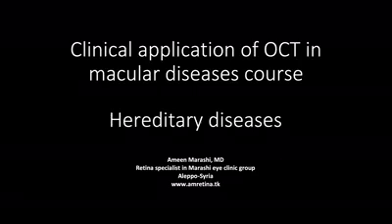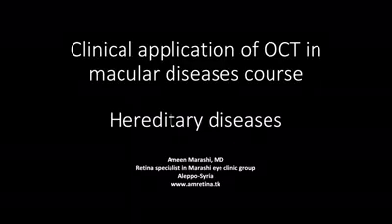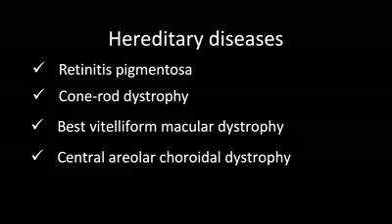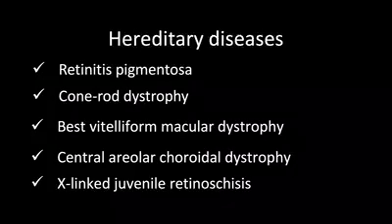I am presenting the course of OCT for macular diseases. In the previous presentation, I discussed pathological myopia. In this presentation, I will discuss OCT's clinical applications in hereditary diseases, including retinitis pigmentosa, cone-rod dystrophy, Best vitelliform macular dystrophy, central areolar choroidal dystrophy, and X-linked juvenile retinoschisis.